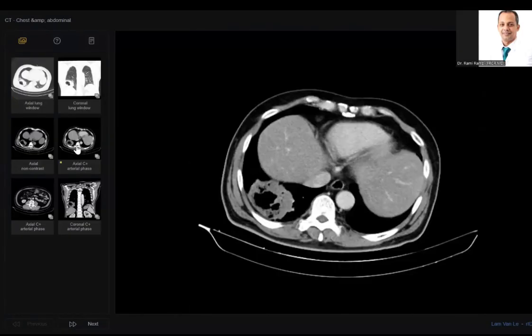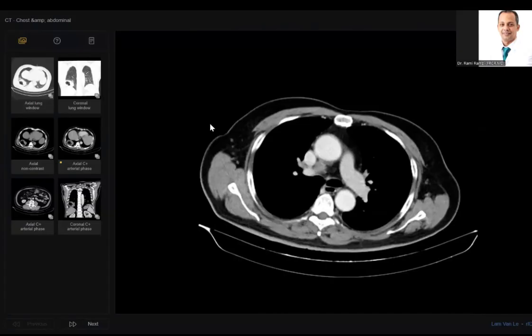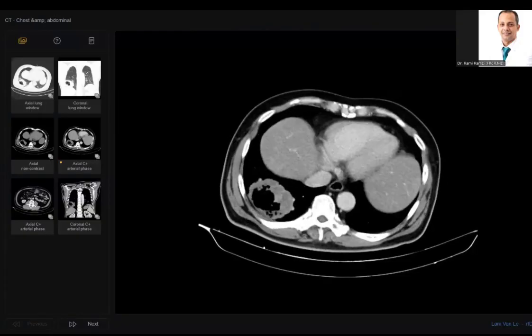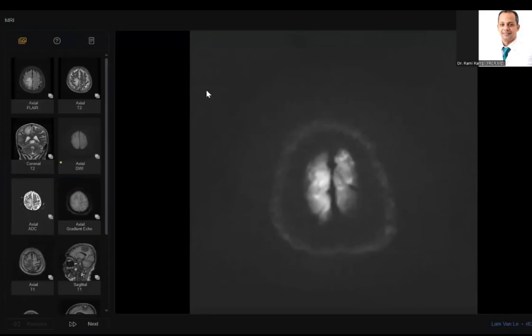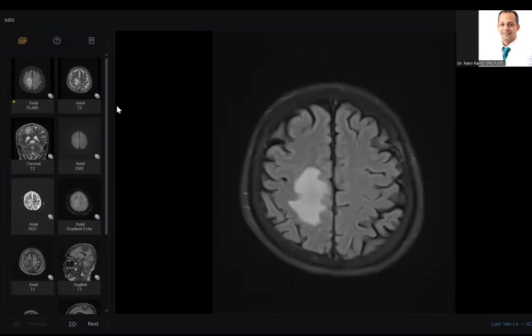Keeping in view the age and the imaging features, having lobulated margins and this sort of imaging features, it's most likely concerning for a malignant lesion. Okay. The GP transferred him to the hospital, and after that he developed some sort of weakness. What do you think?